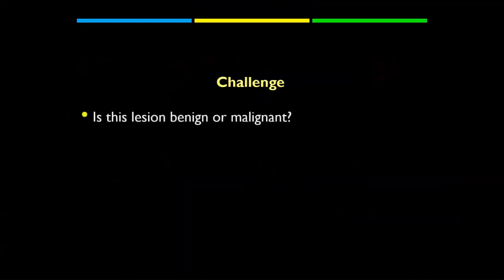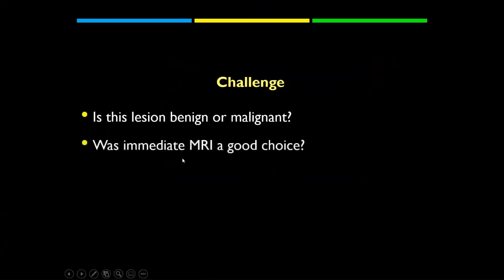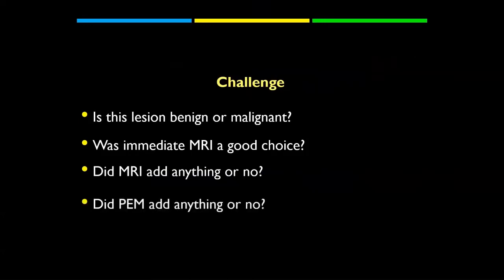So the challenge in this case is, is it benign or malignant? And was immediate MRI a good choice or no? Did MRI add anything or no? And did PEM add anything or no?